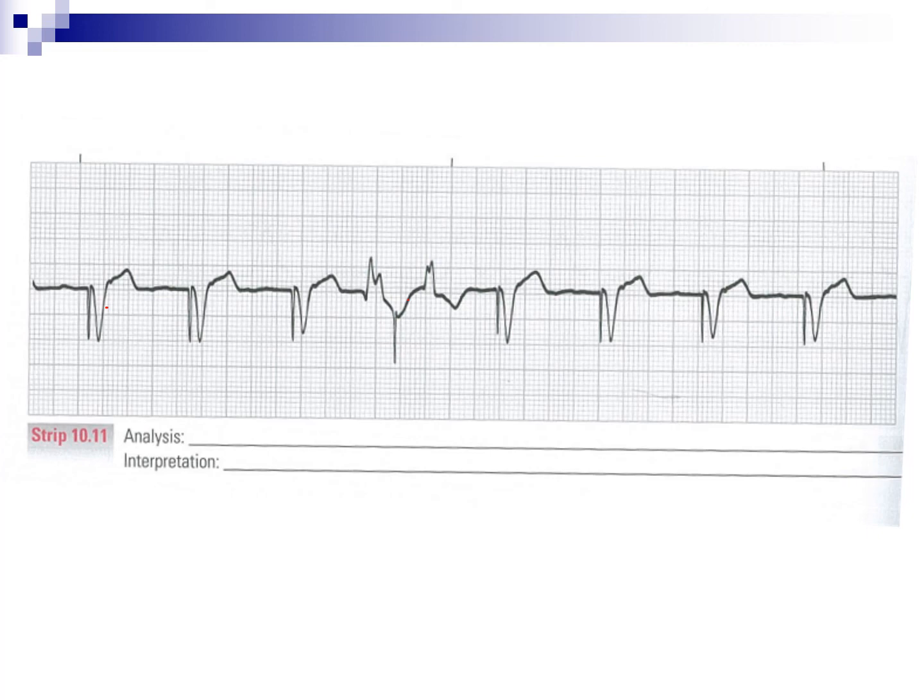So what you would do is you would turn up the sensitivity so that it can be seen better. Gain.